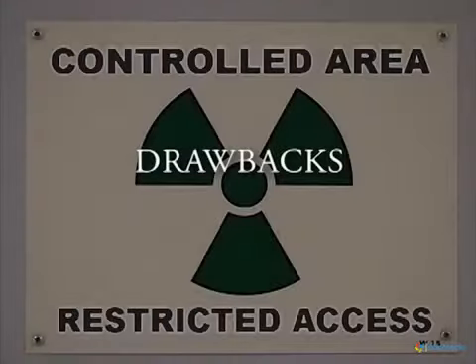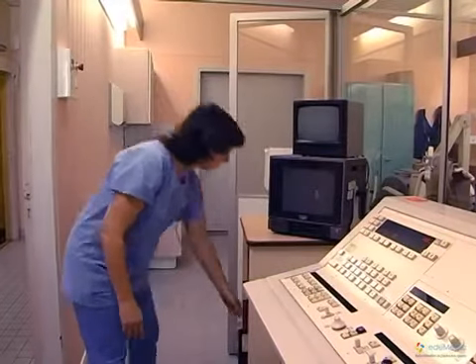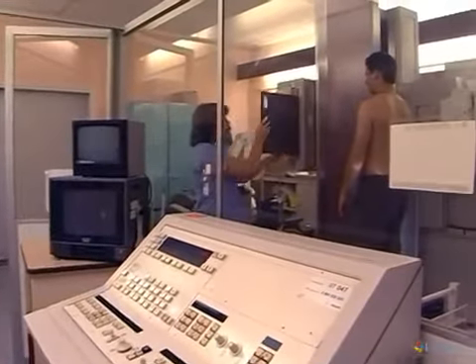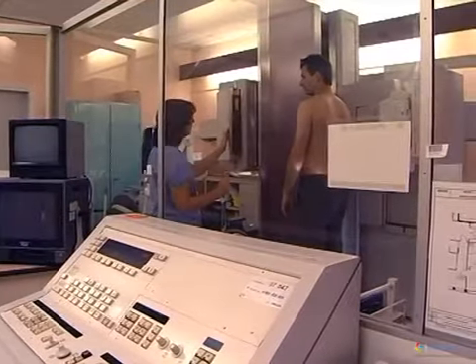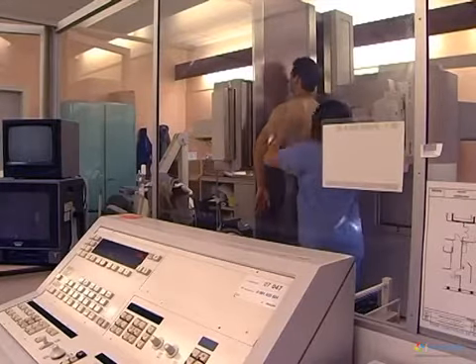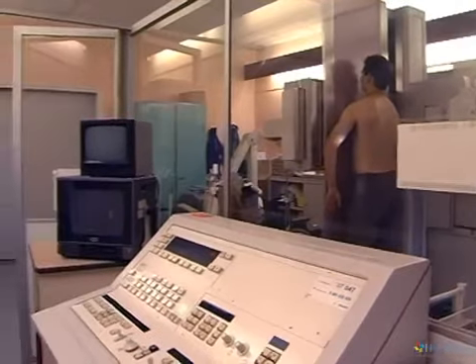X-rays present a danger that cannot be underestimated. This radiation can produce changes in DNA and so damage cells. But everything here is a question of dosage. As the effects are cumulative, even if the dosages employed are very low, the number of radiographic examinations must be limited, and they should not be prescribed for pregnant women.